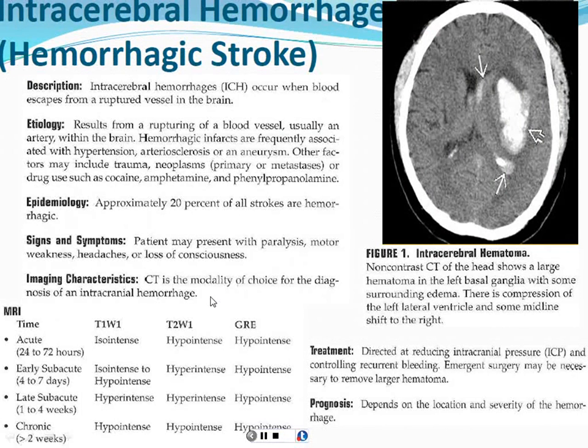And this is an example of a certain kind of intracranial hemorrhage, and this is shown on CT, but you will obviously see this on MRI as well. In this case, it's a CT, and blood is very bright on CT. It's all this bright stuff here. It's in the basal ganglia area of the brain, which can frequently happen with a high blood pressure kind of hemorrhage. Sometimes the blood will spill into the ventricles and pool in the ventricles here.